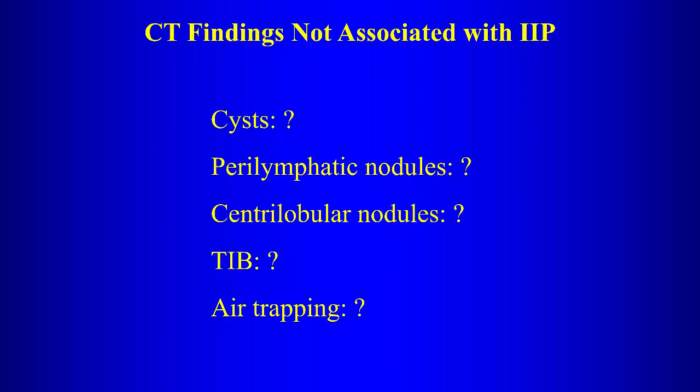Also, you can have centrilobular nodules in a tree-in-bud pattern. What does that point you towards? Small airway disease, right? So bronchiolitis, infections. So anything that gives you recurrent infections of the small airways, TB, atypical mycobacterial disease. Air trapping, if air trapping is the predominant abnormality in a patient with shortness of breath. You mentioned emphysema, small airway disease. What other disease, especially if there's fibrosis mixed with air trapping? What else do we need to consider there? Fibrosis and air trapping.